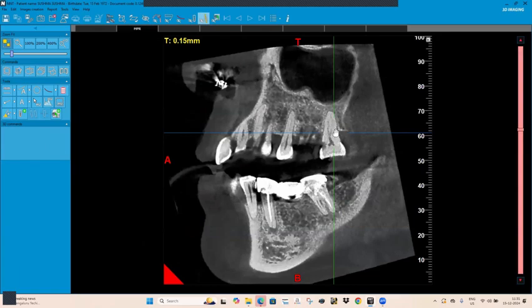So now, actually in this tooth, the two roots are fused, so it will be a little difficult for the distobuccal canal to check for the Vertucci classification. But if we see the distal end of this root, because this is the mesiobuccal root, these are the distobuccal roots. One is the thin faint line and one is this one. So they are going from the coronal pulp chamber towards the apex, but one is going from here and one is going from here. And they are uniting together and exiting as a single canal. So it will be like 2, 1. That is what you see, type 2.